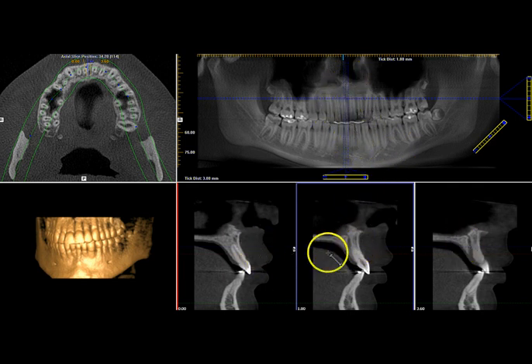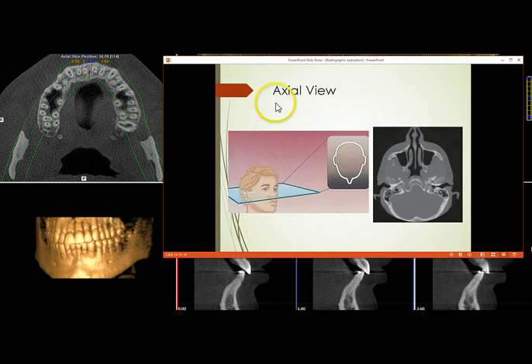And on the bottom, obviously, I have the CT scan cuts, and I'll go through this. So this is the axial view, okay? This is the view if you're looking from the top, and we're going to go slowly down, in the horizontal plane. Okay, so I'll just pull up the PowerPoint. So this is the axial view, right? That would represent right here, and you can see this is a horizontal cut, and either we can go up or bottom, and you can see it over here.